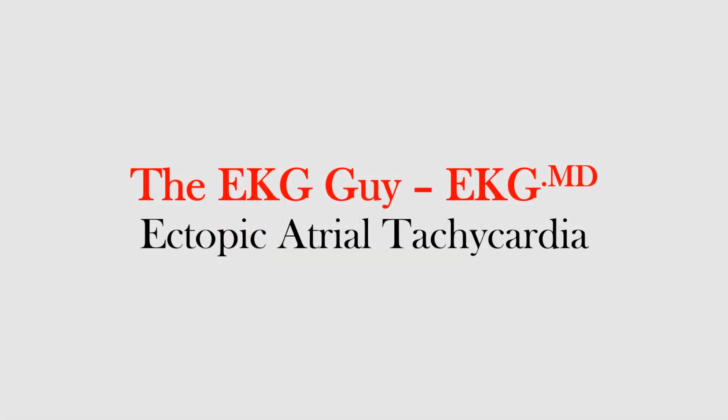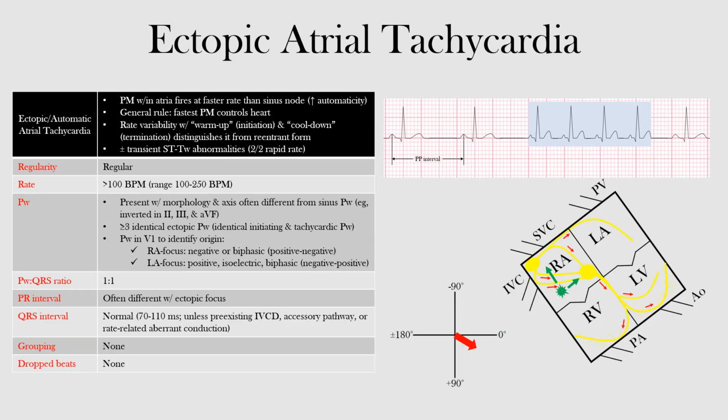In this lecture, we will discuss ectopic atrial tachycardia and how it would appear on the EKG. Primary atrial arrhythmias are a form of narrow complex tachycardias. Just as the name implies, ectopic atrial tachycardia originates from a focus within the atria, but outside the sinus node. Some focus within the atria fires more quickly than the underlying sinus rate. You may also hear it referred to as an automatic atrial tachycardia.